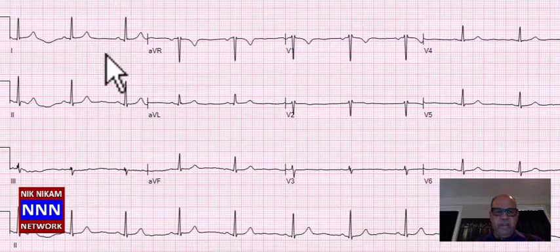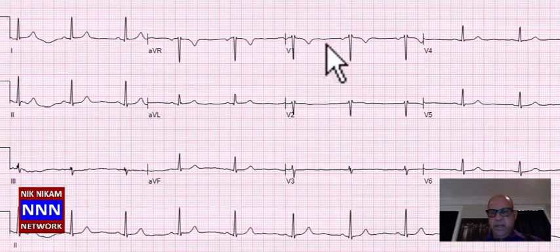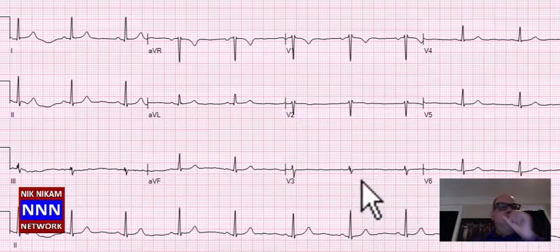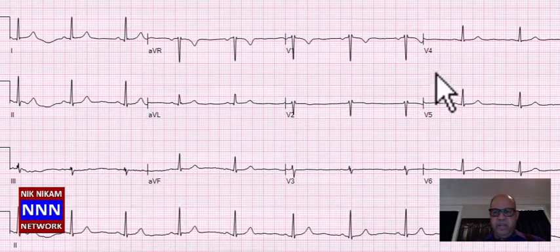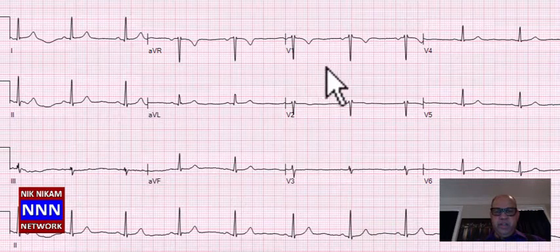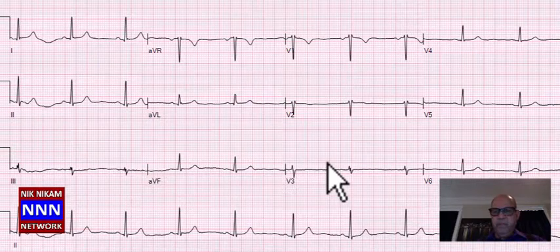Okay, we have a sinus rhythm. Inferior leads look okay, anterior leads look okay. There is lack of R wave progression, RSR prime, incomplete right bundle branch block, the lateral chest leads okay. So we have a sinus rhythm with possible lack of R wave progression or an old anteroseptal myocardial infarction along with no other significant findings.